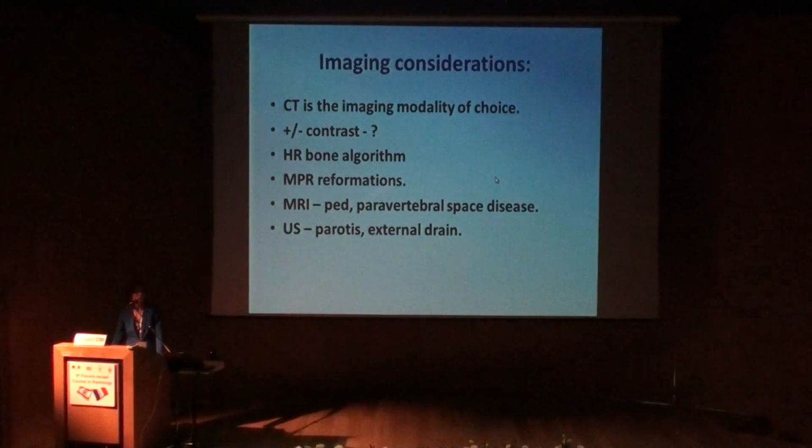Let's skip that. If we try to determine what study to perform, what are the imaging guidelines, CT is not a bad word in imaging of deep neck infection. It is the imaging modality of choice. And why is that? We can see bony details, you can see the tooth in the sockets, you can identify sialolith in case of sialadenitis.